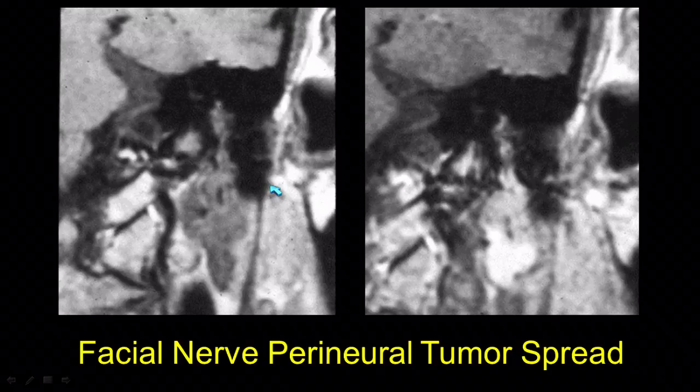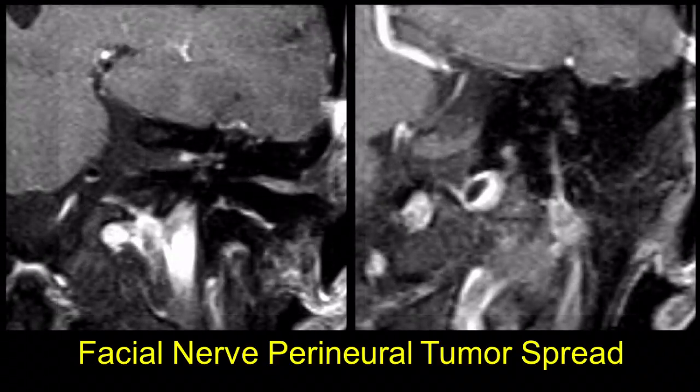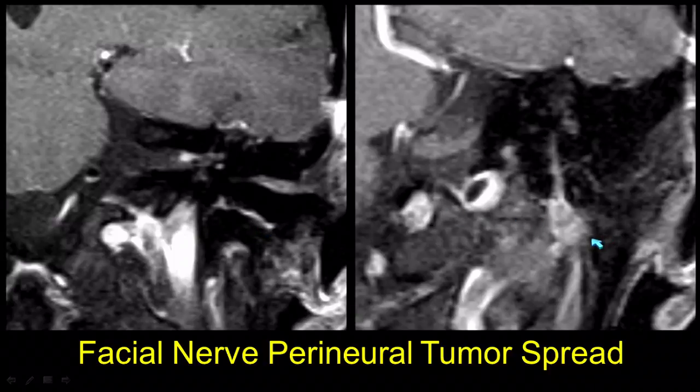So that may extend out distally over the face, or it may go proximally up the stylomastoid foramen, or as we heard earlier, it may go along that auriculotemporal nerve, this strange branch behind the mandible over towards V3. Here's another case where we had a similar lesion within the parotid going up the descending mastoid segment, and this one was going all along the tympanic and labyrinthine segment and enhancing within the lateral IAC itself.